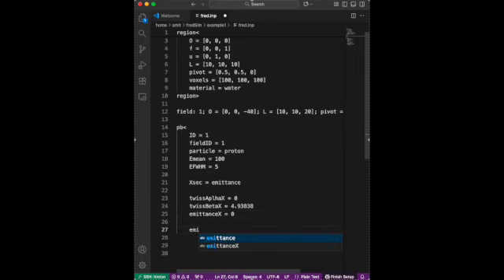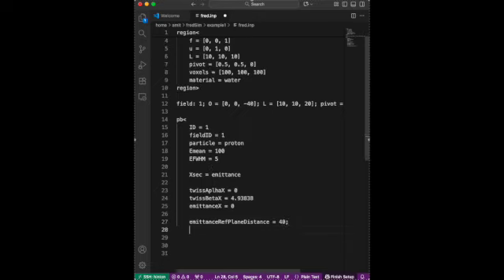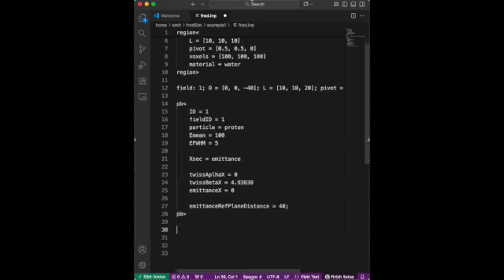And of course, I showed you this emittance reference plane. I hope now you understand, even though I'll show it to you again. PB, that's there. That will do with 1 million particles, and FRED on GPU is quite fast.